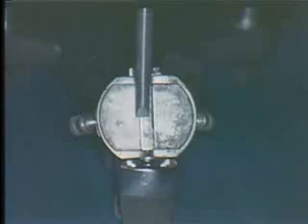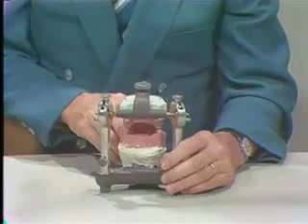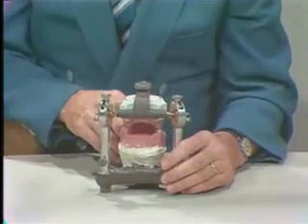Now when we go to the next slide, which still perpetuates the error, because as you set your incisal table, you can see it's not centered, so you're going to be off in your lateral inclination. So this is an error that we would not want you to have, and we're going to show you now how to do this on the articulator, and this is also demonstrated to you in a handout.